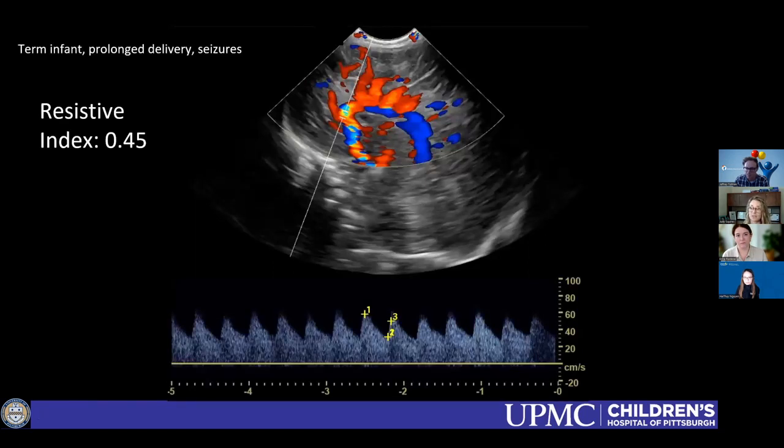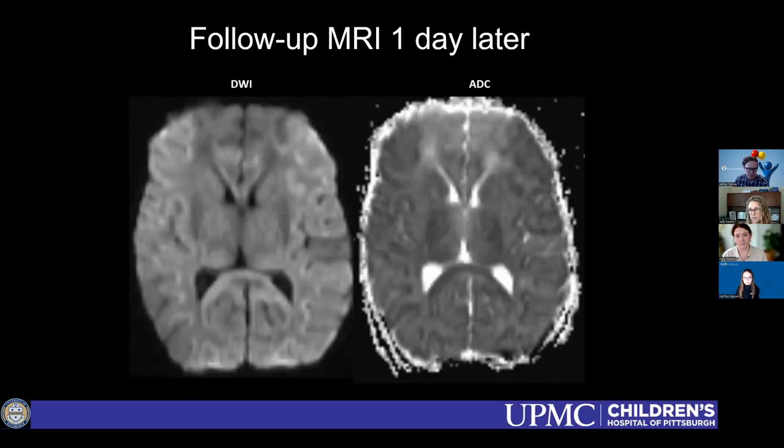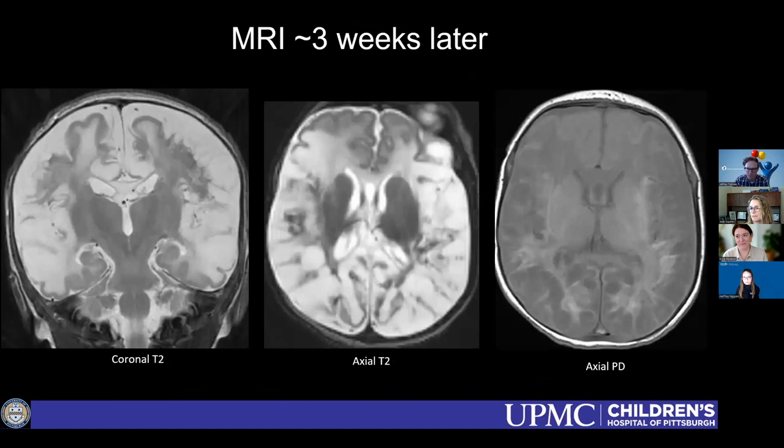So in this patient, we had diffusely abnormal gray and white matter and a low RI, much lower than 0.6. And this was this patient's follow-up brain MRI following cooling. This was one of the cases where our techs did remember to get the ACA Doppler tracing on the first head ultrasound. It's hard to get in there before they start cooling though, and that will have an impact on the resistive index. And this was the MRI about 3 weeks later, just extensive, oh my gosh, badness.